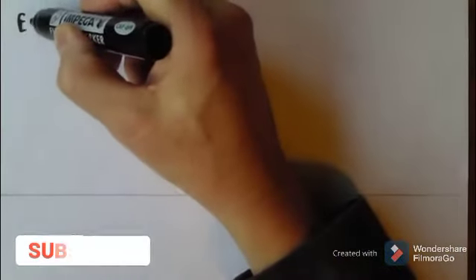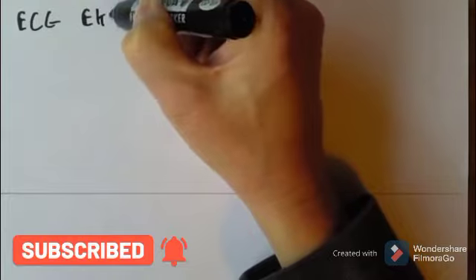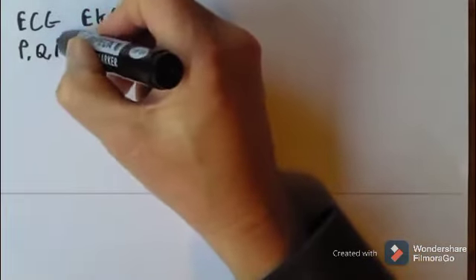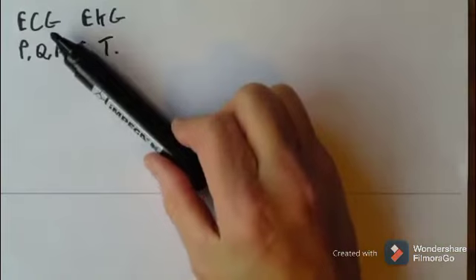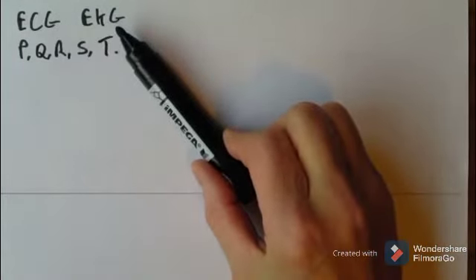ECG, or EKG, and we'll see it's got a P, Q, R, S and a T wave. Now ECG stands for electrocardiogram, as indeed does EKG.